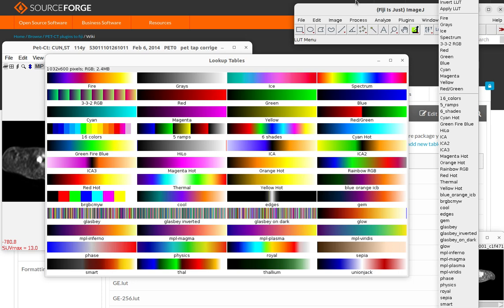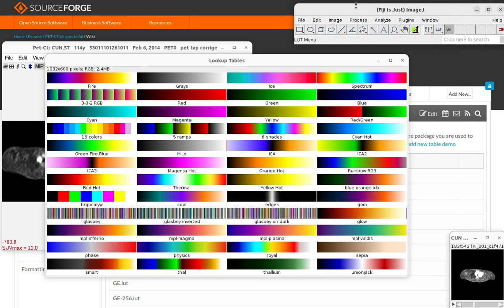Okay? So if I want to add, I take this. I previously explained how you poke around in your software package until you find a lookup table which fits. And if that's all you want to do, you're done.